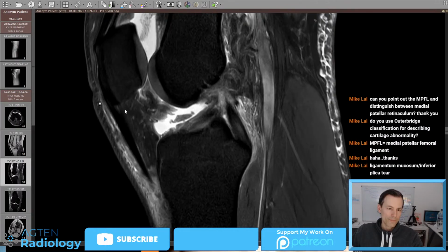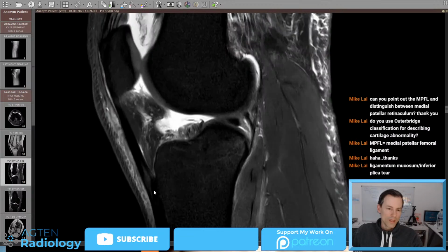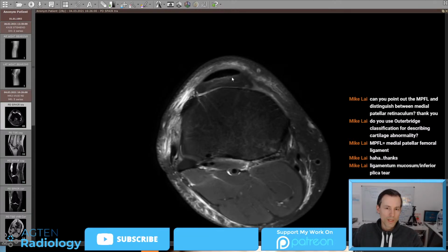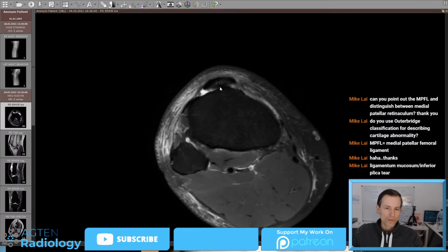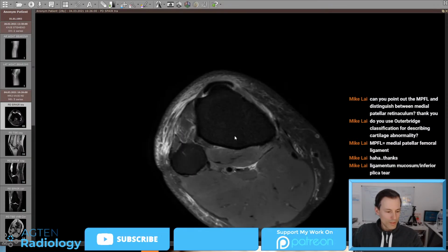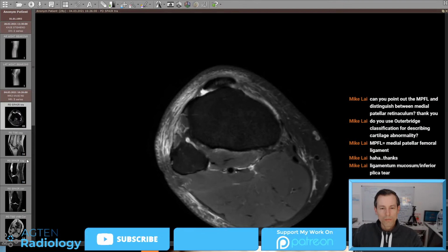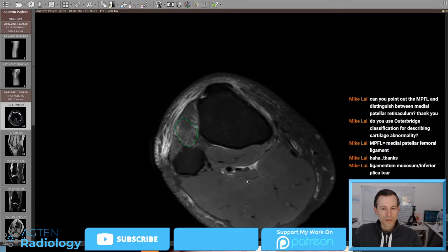So this is certainly just within normal limits. And down here, I probably did not describe this when I was reporting the case, maybe not relevant anyway. I think that's probably the key information here. So I would probably, to make it a little bit shorter, not overcall this as any relevant pathology.